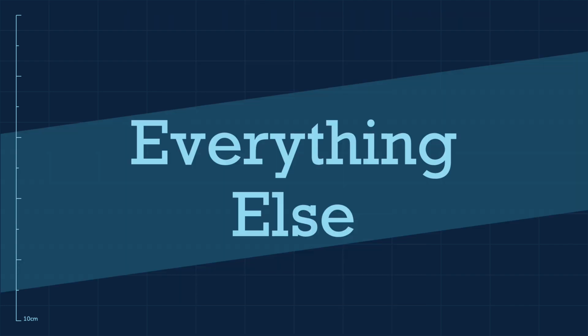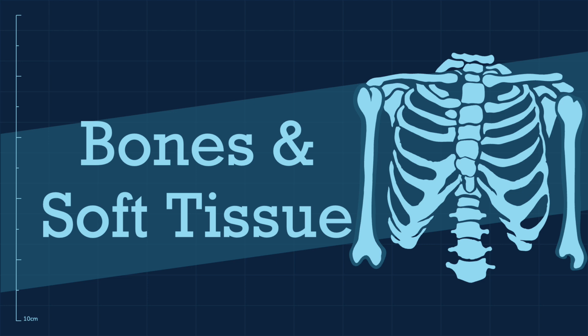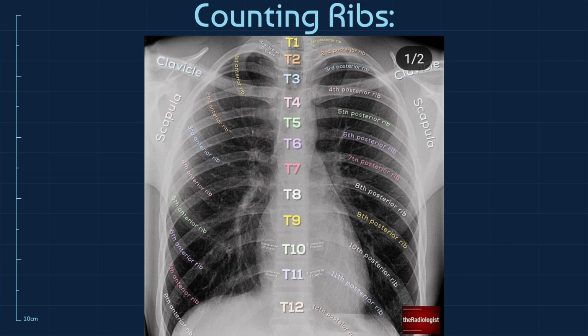Moving on to the final and most filled portion of the ABCDE method, which is everything else, starting with bones and soft tissue. Now, I want you guys to take a second to pause and pay close attention to what this infograph is trying to tell you, specifically when it comes to counting the ribs, because there's a difference between counting anterior ribs and posterior ribs.